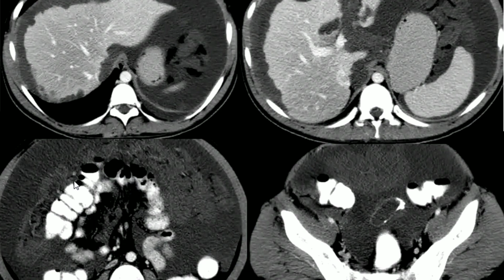You mentioned correctly the bowel loops are displaced in the center, and we have deformity and scalloping appearance of the liver surface, all because of the mass effect from the ascites. That means we are dealing with thick mucinous fluid that can cause this deformity and scalloping of the liver surface. In addition, we have some subserosal deposits around the liver, which means a neoplastic process.